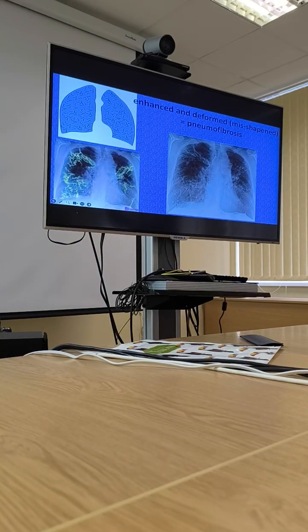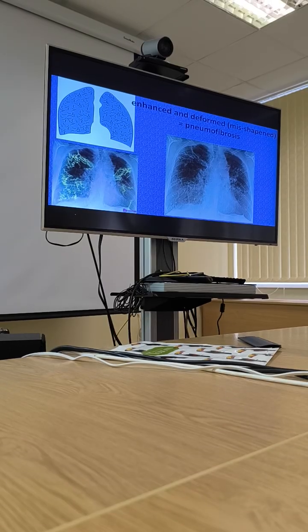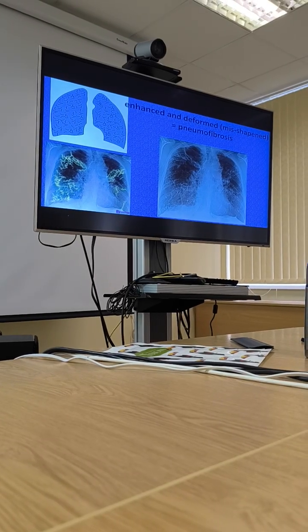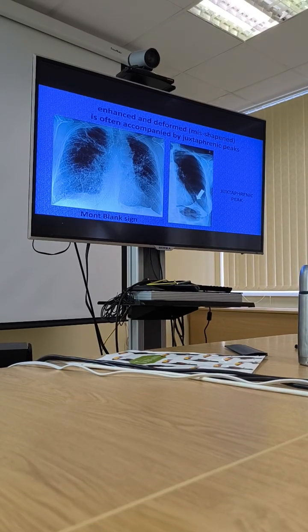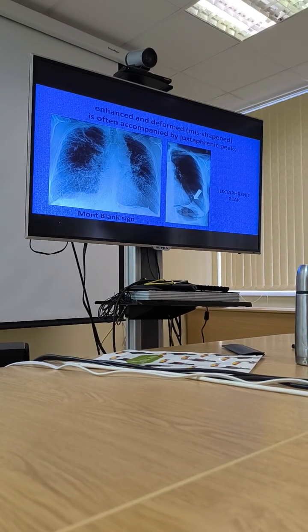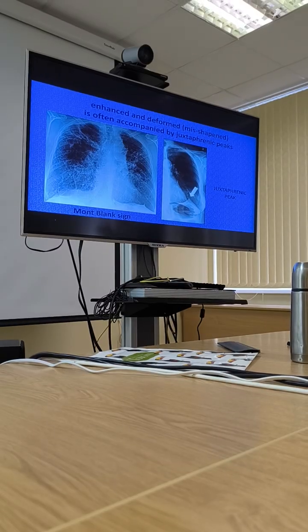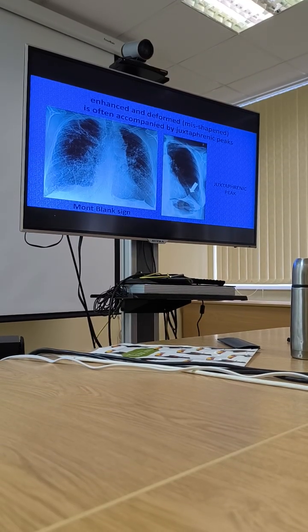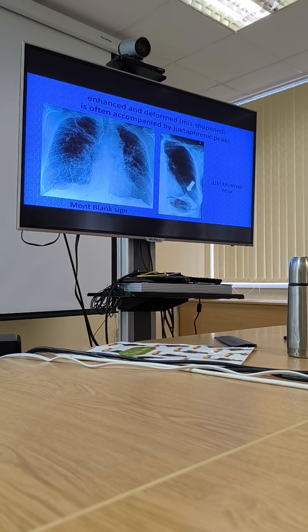Can you feel what the diaphragm shape is? It is very special. It's like flat surfaces with peaks. These peaks are named juxtaphrenic peaks. This is fibrotic tissue adhesions. So this is a sign of previous diseases like inflammations and fibrous tissue production. Then it is like the whole diaphragm. Sometimes it's named the Mont Blanc sign, like a mountain view.